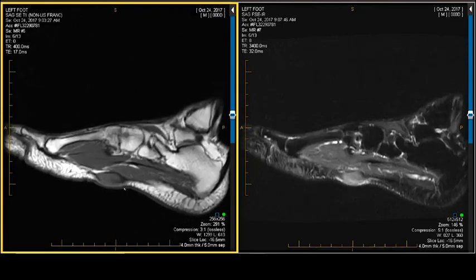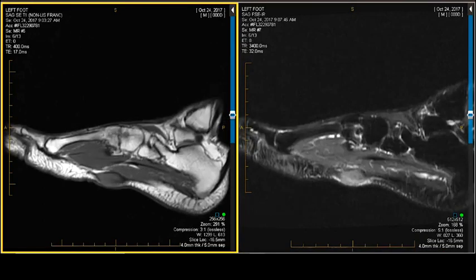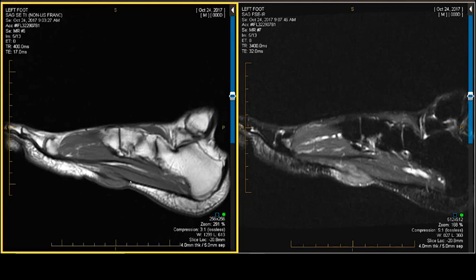A spindle-shaped lesion. He had trauma. It's a hematoma. Well, where's the methemoglobin staining? Why is it 2.5 months? If it's an ossified hematoma, why isn't it dark? Who ever heard of a hematoma in the plantar fascia and aponeurosis? It could happen, I guess.